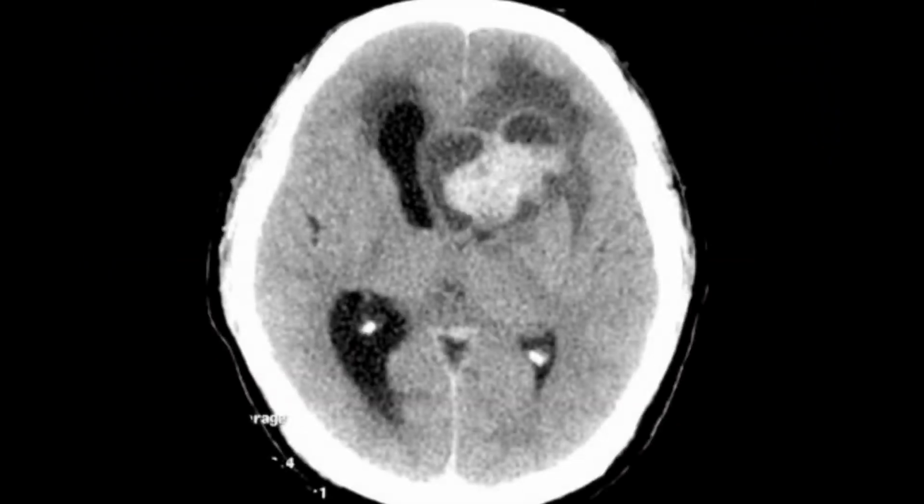Another example of the ependymoma, it is a low grade tumor and it is arising from the ependymal cell. You can appreciate that this is a hyperdense lesion. It is well demarcated and it is involving, I would say, the left anterior horn of the lateral ventricle, as ependymoma is always arising from the ventricles. Here calcification can also be seen, and it is usually associated with hydrocephalus.